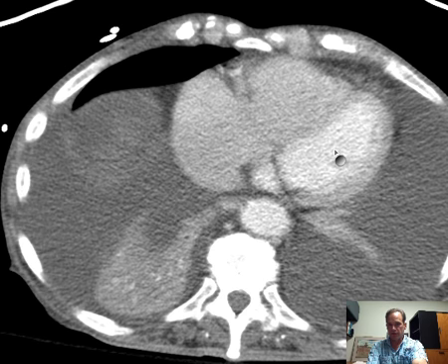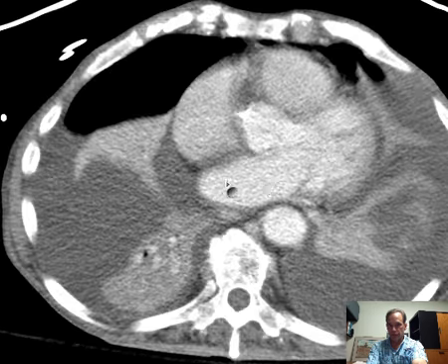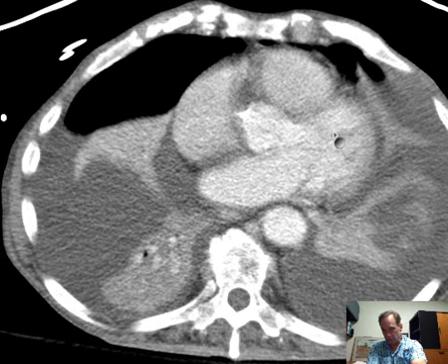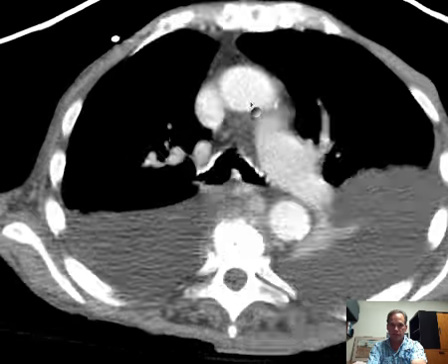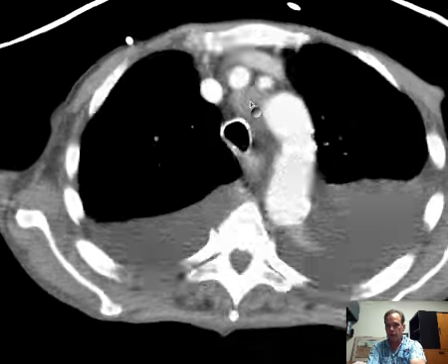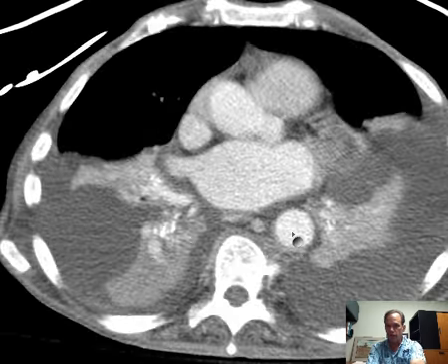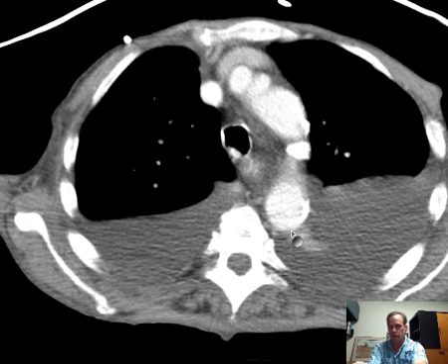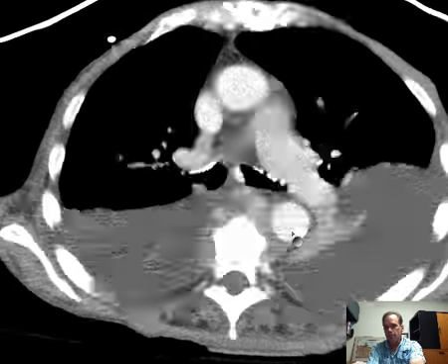Here's the left ventricle, right ventricle, left ventricle. You follow up, and you'll see two things. The left atrium empties into the left ventricle, and the left ventricle empties into the aorta, which then continues superiorly as the thoracic aorta, the aortic arch. Of course, this is the ascending aorta, the aortic arch, and then the descending aorta, all of which are components of the thoracic aorta. Let's take a look now at the main pulmonary artery.